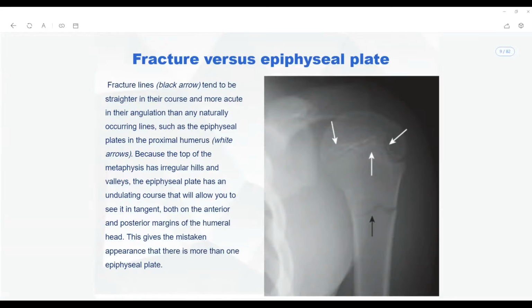Well, I haven't come to the fracture part yet, Benedict. First, I'm trying to teach you how to learn about the sites. Once you have learned about the site, you start looking at the radiolucent lines that are present. The observation of the radiolucent lines tells you about the age. You are trying to make sure whether you are looking at a child, an adult, or a geriatric patient, so making sure what the normal parts of the bone are. That is the next step.